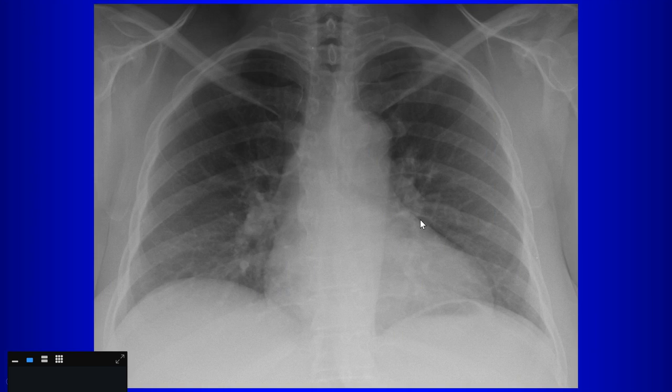And it comes up sometimes, from the ER, they'll call us and ask if that's a pneumomediastinum next to the heart. This is a common location where it looks like there's a lucency next to the heart, but because of the pulmonary artery there and the density at the edge of the heart, sometimes people mistake that for pneumomediastinum. But as a radiologist, you recognize that's just an optical illusion, if you want to put it that way, and it's not really pneumomediastinum.